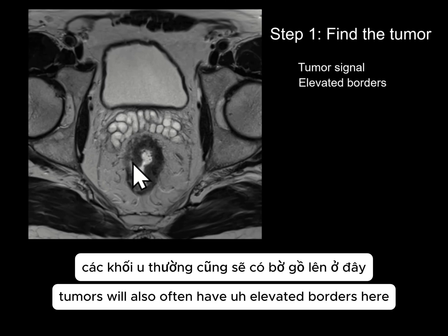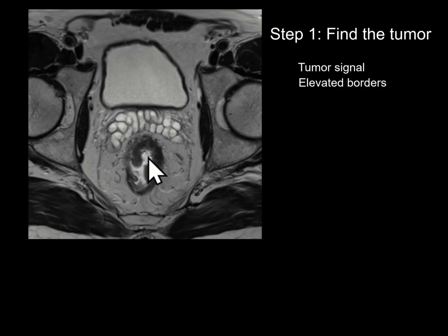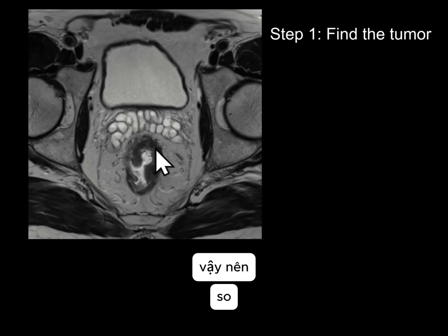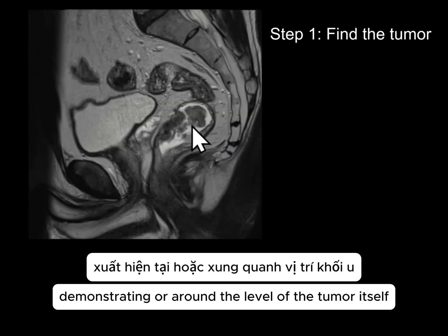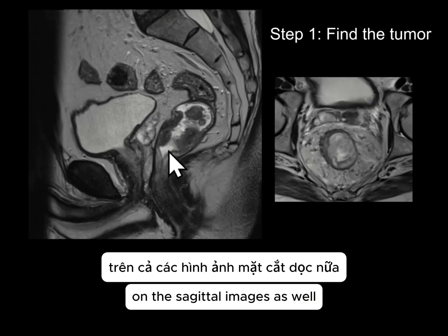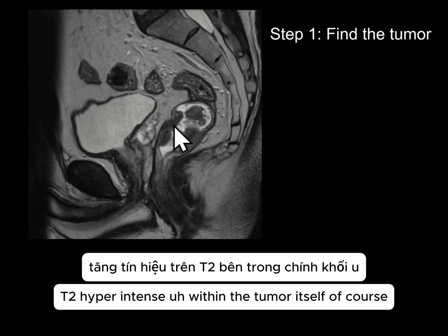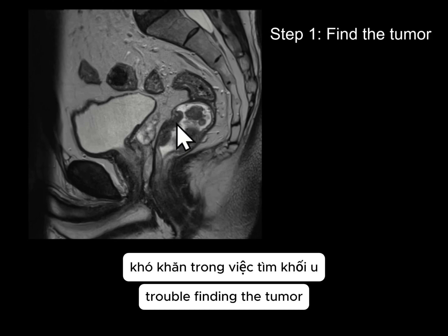Tumors will also often have elevated borders. So for example, you can see the elevated borders of this tumor here. And there's often accumulation of mucoid material within the lumen outside of the tumor, even in these non-mucinous lesions. So this is a non-mucinous tumor with mucoid material here, around the level of the tumor itself. You can see that here in the lumen, here on the sagittal images as well. Mucinous tumors themselves, which have a worse prognosis, on the other hand, would be more T2 hyperintense within the tumor itself, of course. Ideally, you should be consulting the clinical notes, especially if you're having trouble finding the tumor.